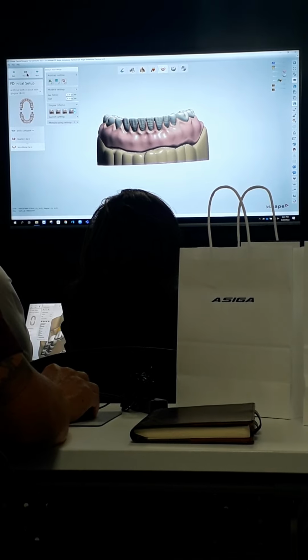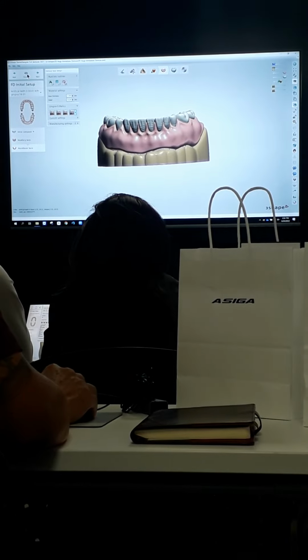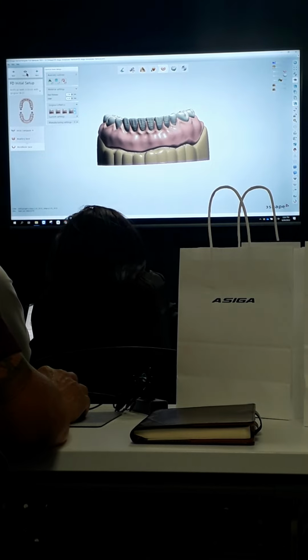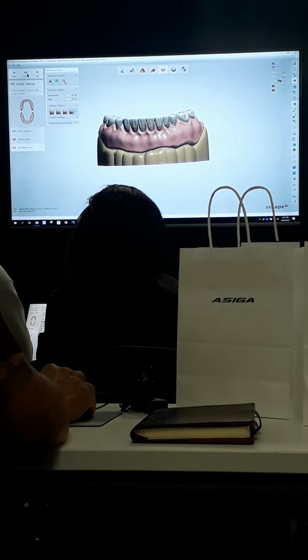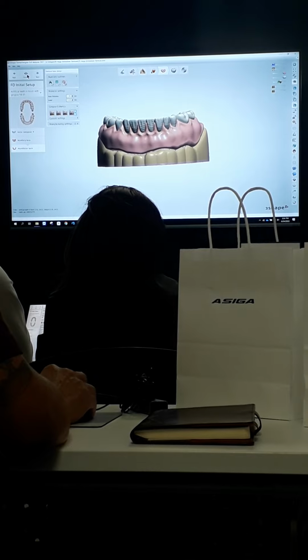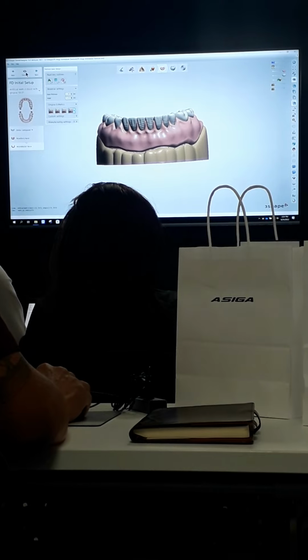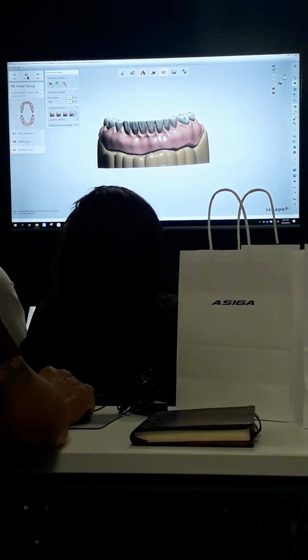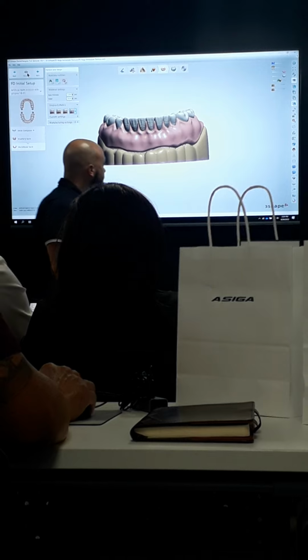Denture with the holes, which allows me to convert it. And the implants are fairly decent, too. And these are corrected. We'll see. We shall see. So there you go. It was that spline that was causing it.